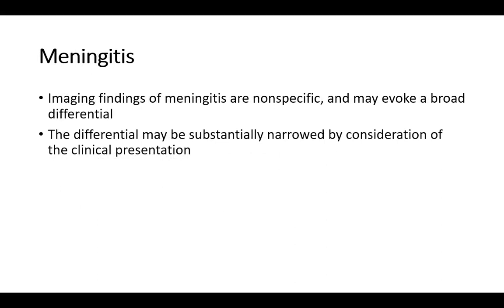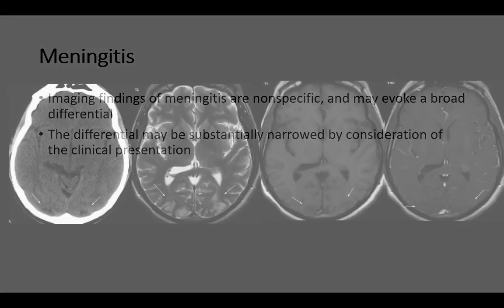This is a case of meningitis, and usually the imaging findings of meningitis are non-specific and may evoke a broad differential diagnosis. It's usually narrowed by consideration of the clinical presentation.